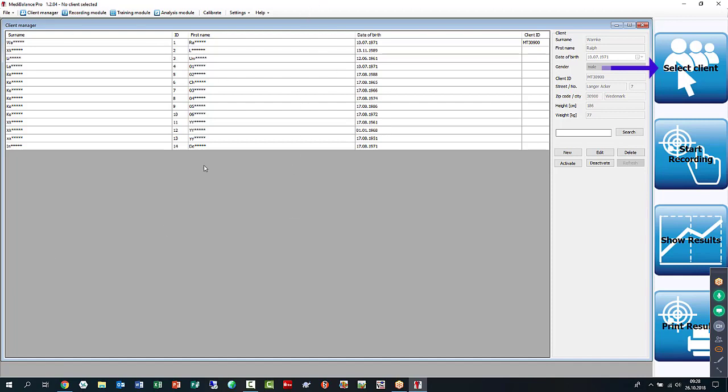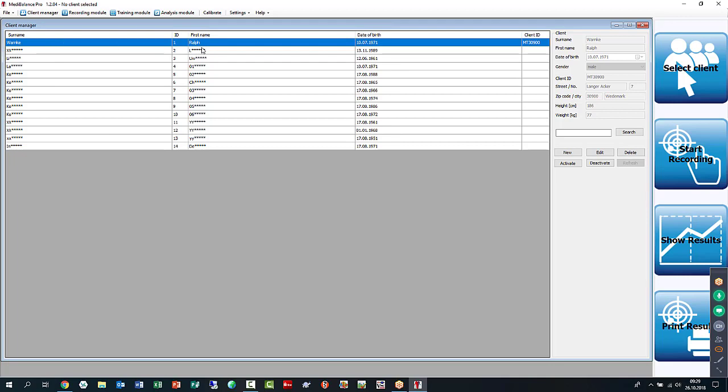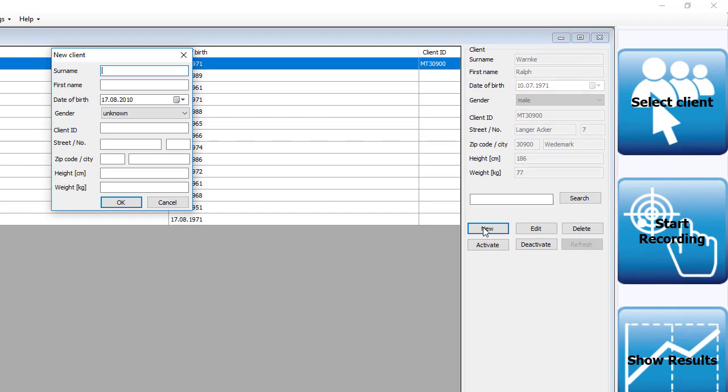I have my list of clients. They are anonymized so that a new client cannot see who has been there before. If you click on one of those clients, the name will appear in full so that you know if you have the right client at hand. If not, you can always go and add a new client, which we'll do right now.